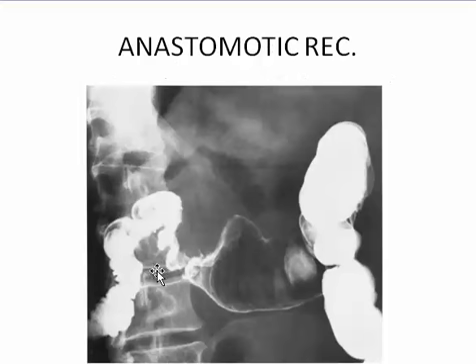This is the appearance of an anastomotic recurrence. There is irregular narrowing, irregular structure at this region with some protruding leakage, and there is definitely a soft tissue mass indenting the region, an anastomotic recurrent tumor along the colon.